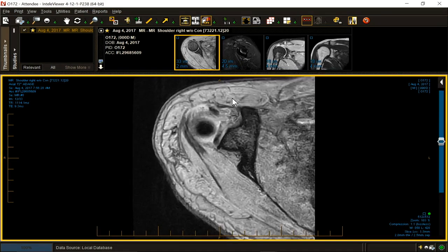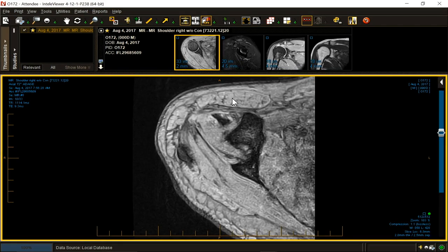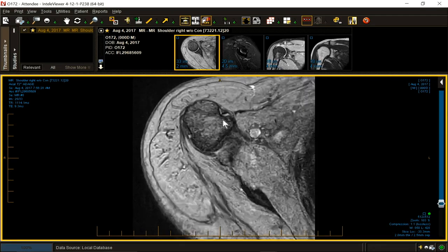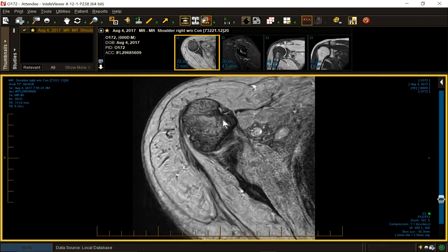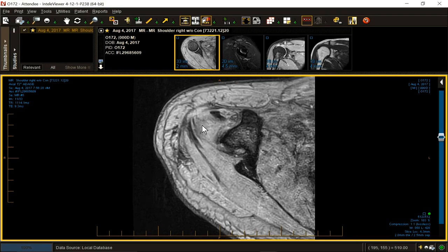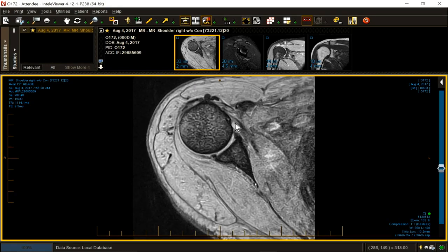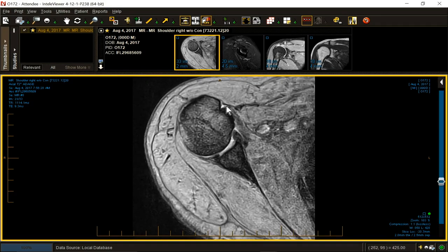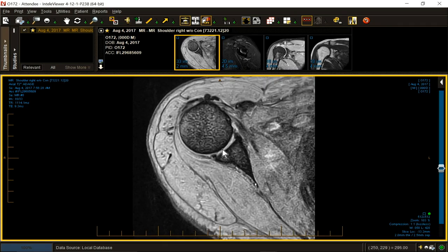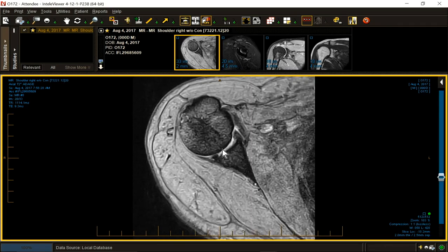Let's scroll. Top down, extra objects of hypointensity. Down low, nothing. Rotator cuff, present. Subscapularis, present. Biceps, present. Centering, normal. Labra, normal. Capsule, normal. Chondral interface, close to normal.